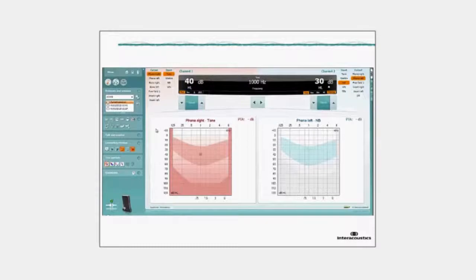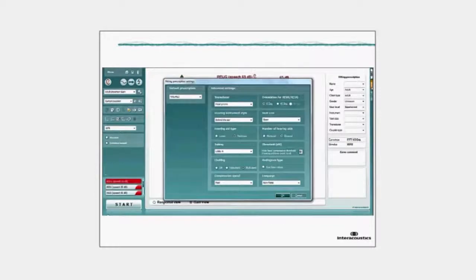Once again, I have a video to demonstrate this. And what you will see is that I'm importing an audiogram and deliberately not entering a heard point at 2 kilohertz. So I'll have no response there and continue to click. Once I've added this, I'll then move into the REM module and demonstrate with NAL2, although even though the examples are shown with NAL2 in this video, it also applies the same for NAL1.